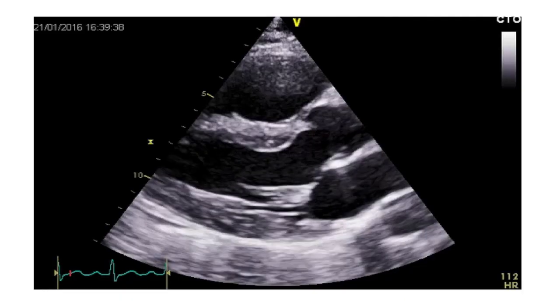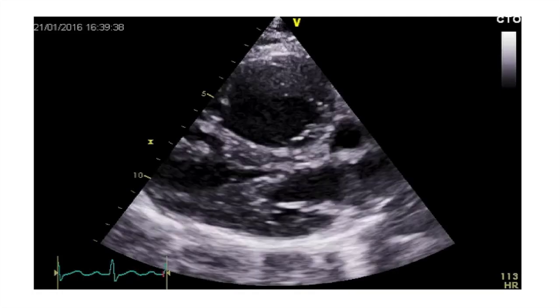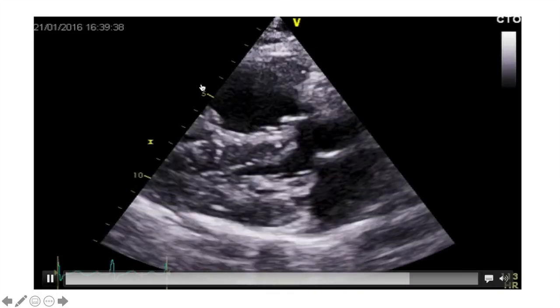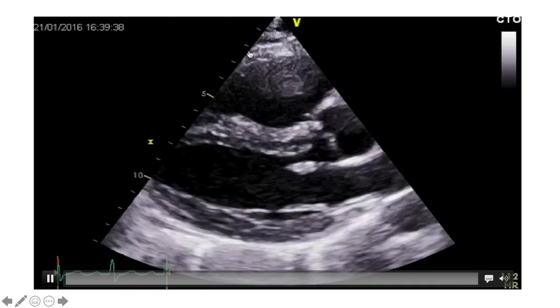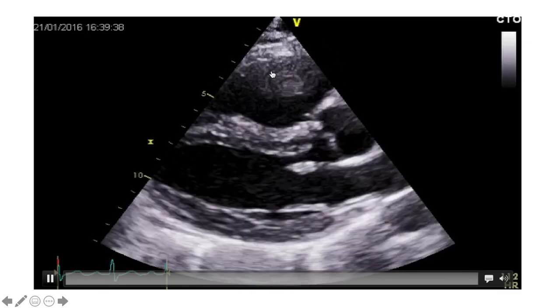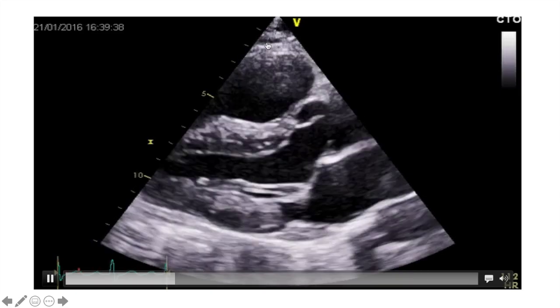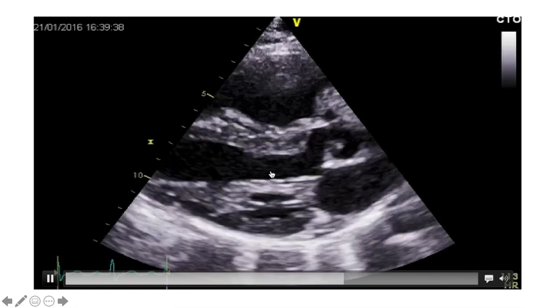So let's look at the right heart when it goes horribly wrong. Now, if you think back to the previous slides where we've looked at normal, here you can see the right ventricle is taking up way greater than 1/3 of the whole cardiac width in this view. So it's very prominent. It's definitely greater than 2 centimeters. And actually, quite disturbingly, the left ventricle looks pretty squished. So the right ventricle here is actually causing septal deviation into the left ventricle.